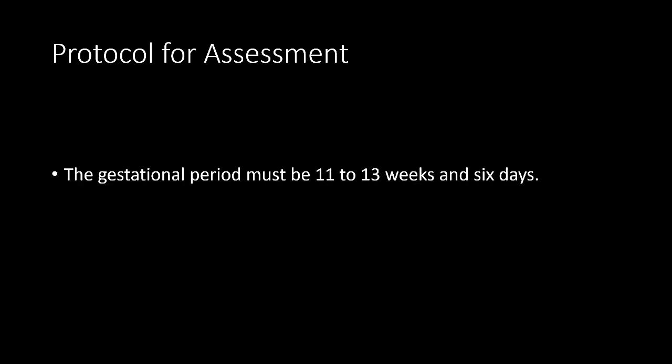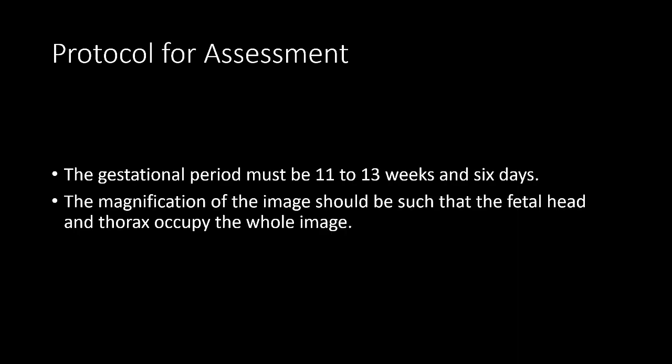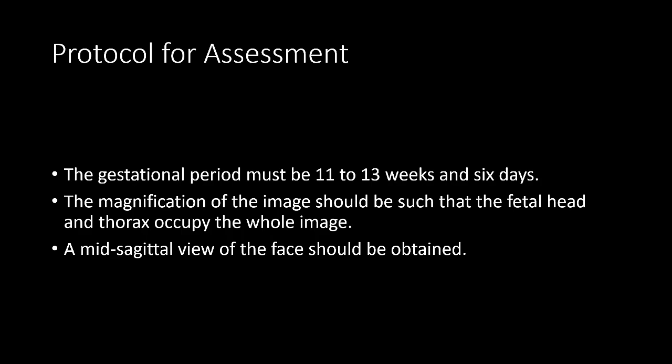Nasal bone assessment. Protocol for assessment. The gestational period must be 11 to 13 weeks and 6 days. The magnification of the image should be such that the fetal head and thorax occupy the whole image. A midsagittal view of the face should be obtained.